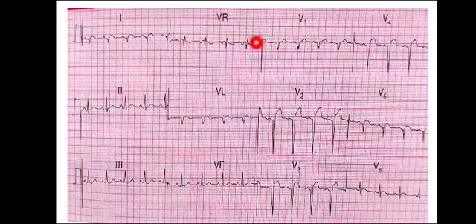So what is the total assessment of the ECG? We have found Q waves in lead 1, AVL, V2 to V5, and raised ST segments in lead 1, AVL and from V2 to V5. So the total assessment is that when there is presence of Q waves, this means that a certain time has passed since the infarction. So this represents old infarction, but the presence of ST segment elevation signifies that there is an ongoing infarction, or a present infarction, here.